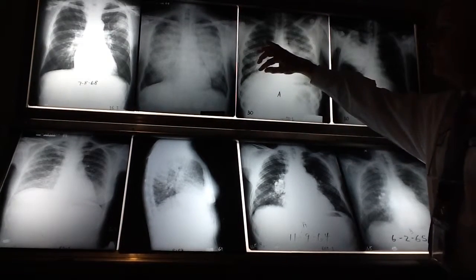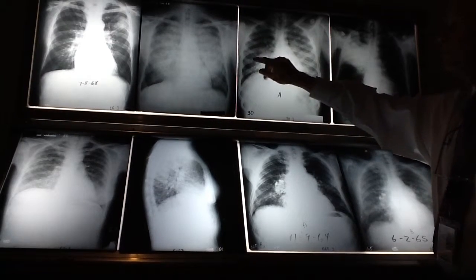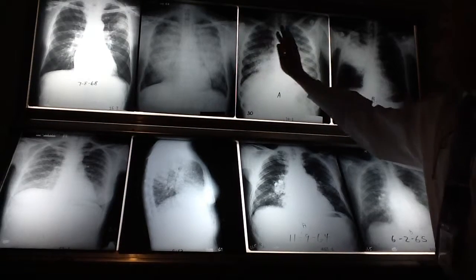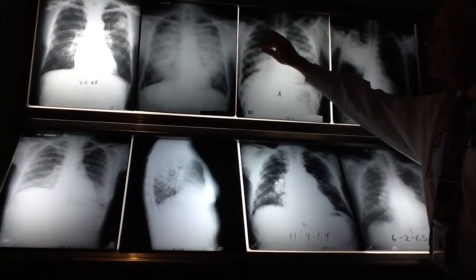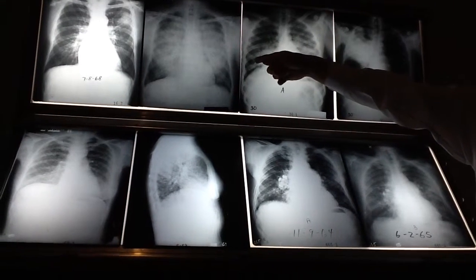Bilateral, yep, in close. It's just not all the way up here yet. This is just an earlier example of this. This is like half a butterfly shadow. It's still bilateral, still medullary, just not all the way up here yet. You know, give them another 3 or 4 hours, it may look like that one.